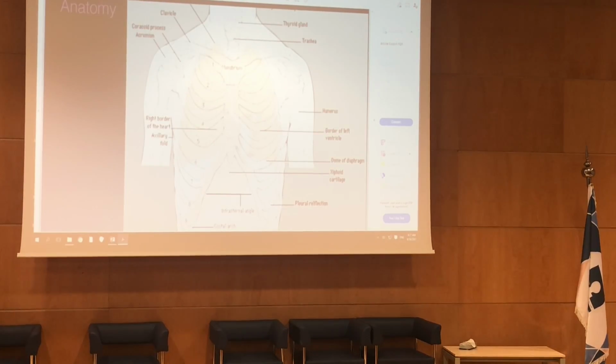what else? So yeah, this is basically it. This is what you see. And what you see, you have to comment on. Like, you cannot miss a bone lesion that's within the field of view. So you have to be very systematic when you're checking the X-ray.